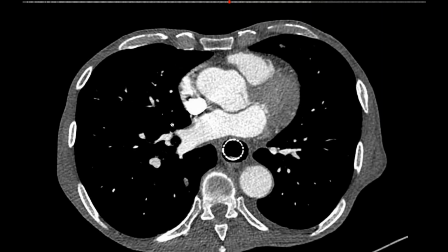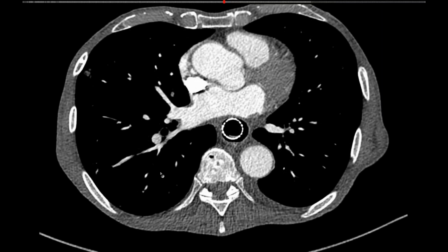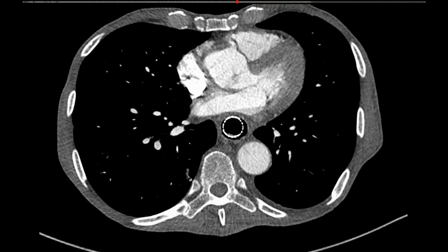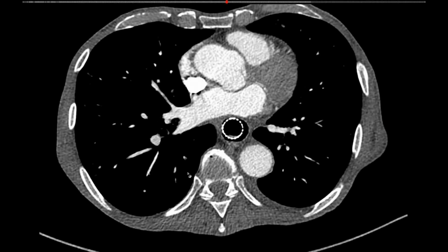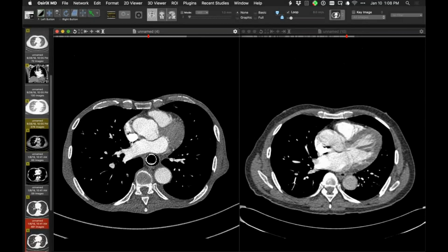elsewhere, you'll easily be able to appreciate that there is a vessel that goes there, and then at this point it's very distended with intraluminal material. So the findings here are very typical of intravascular metastases, both within segments of segmental arteries as well as lobular arteries. This is a case of esophageal cancer. I don't have pathologic proof, but I'm very certain that that's the diagnosis.